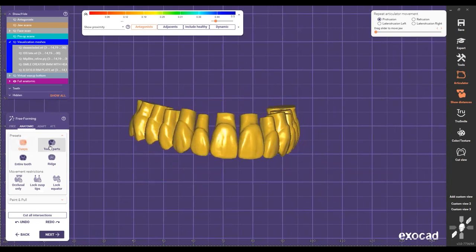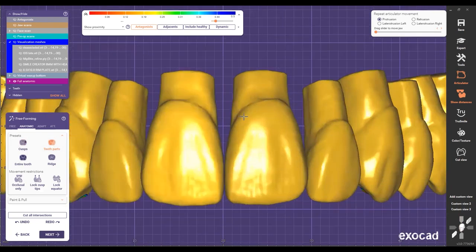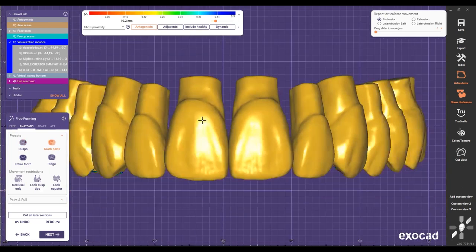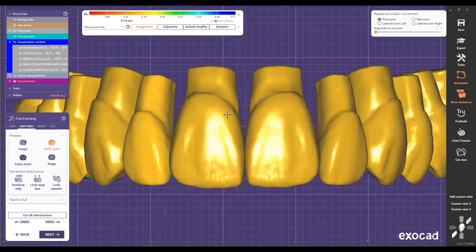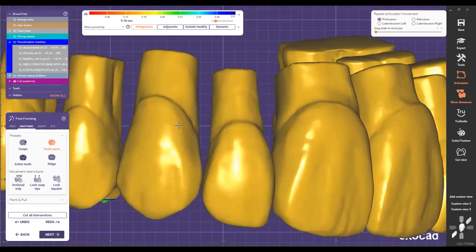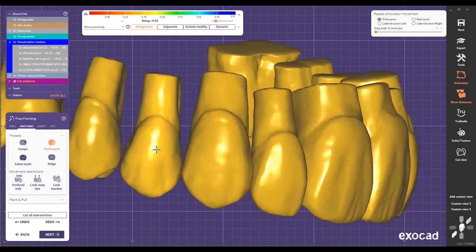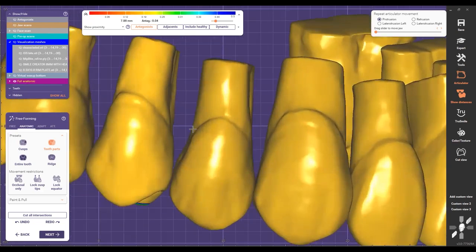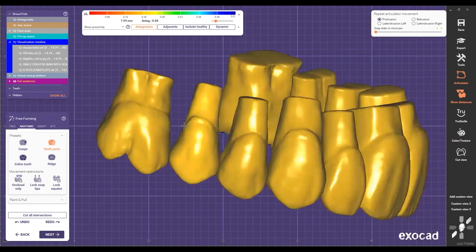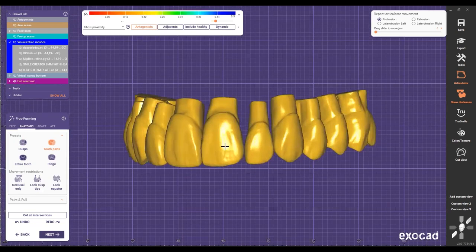Let's say what I like to do from here is close these papillas right here, so I don't have a lot of pink showing there. So I want to close these areas, so aesthetically it's going to look much better than having a lot of pink right there. Okay, that's very important for you guys to know, because we need to make sure that we show more teeth than pink.